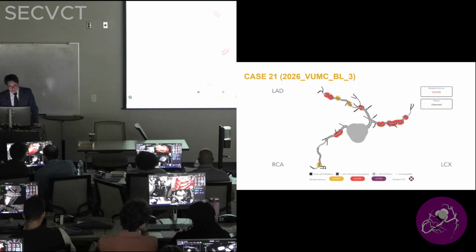Okay. Yeah, this is what they show at the roadmap. Roadmap again, it's doing relatively well here, calling moderate here, although it's more severe. So again, not perfect, but it's pretty impressive.